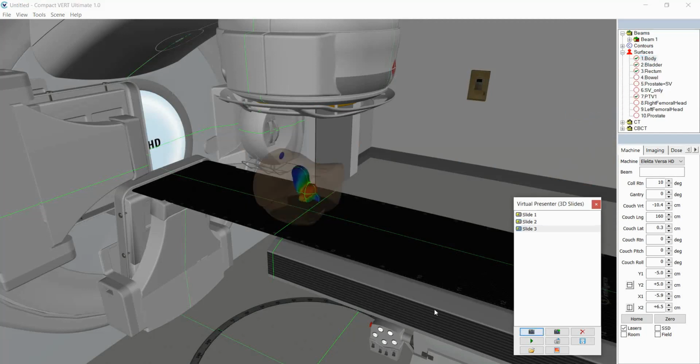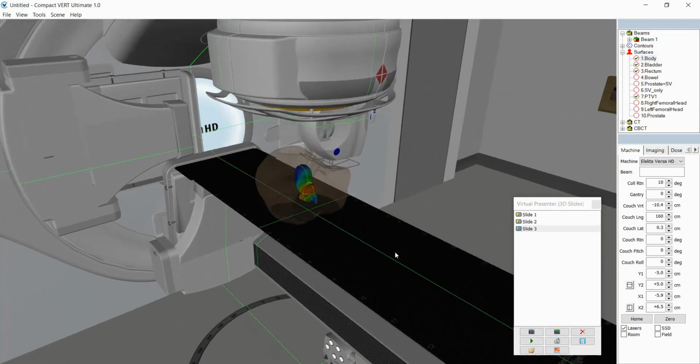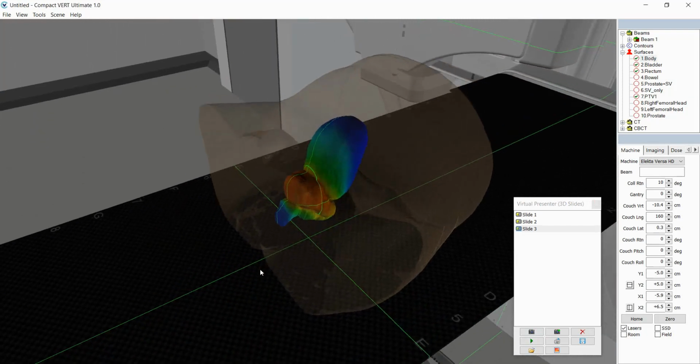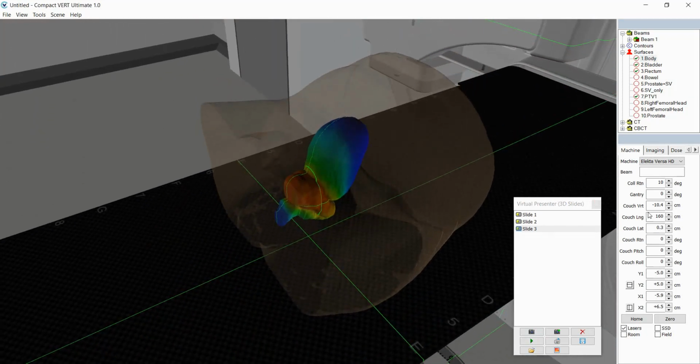If you click on the Camera Plus slide, this also remembers the exact viewpoint, position and angle. This is helpful if you want to recreate a specific point of view.